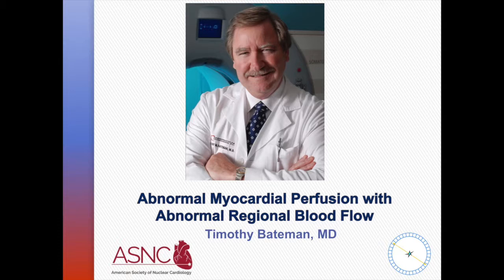So at the moment, what we would be assuming here is that we have a high-grade lesion, presumably in a dominant right coronary artery. But as you said, there could be much more extensive disease, or this might be all that this patient has. However, a very unexpected finding. So let's move on and look at another piece of information that will help us to better decide what is happening here.